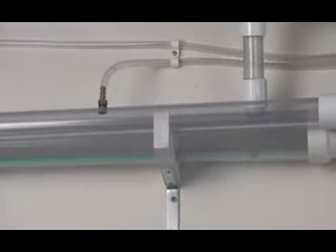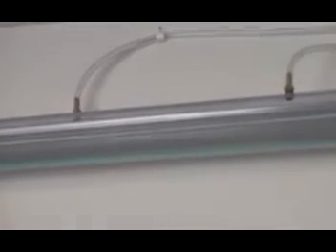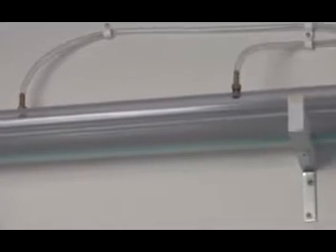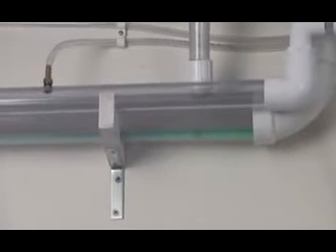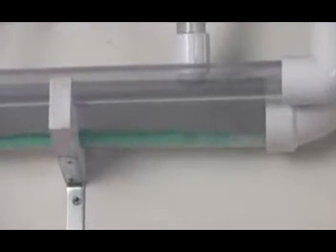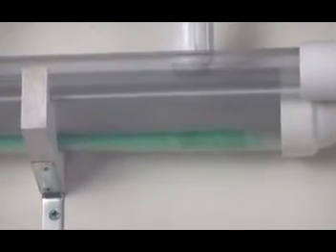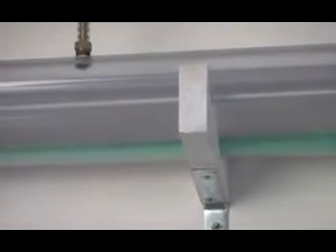As the suction device is shut off, you can see the flow of liquids in the trunk line slows way down and almost stops, causing whatever has been sucked up to sit and not necessarily move. As we introduce air into the system, that air helps cause those liquids to flow back to the collection tank to clear that trunk line of any debris that it might have.